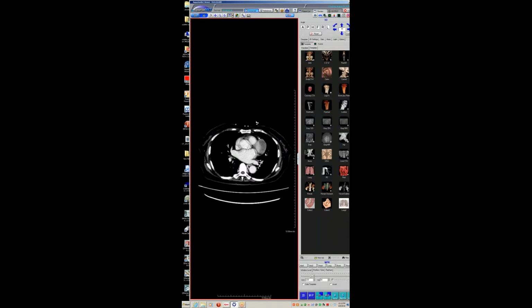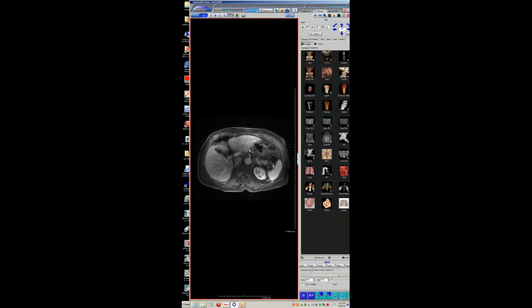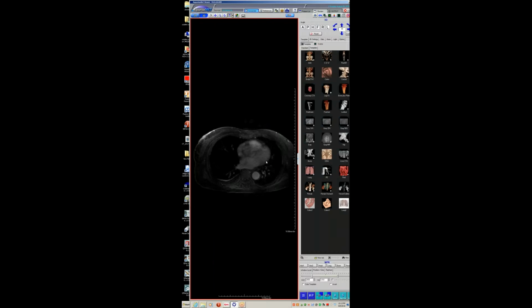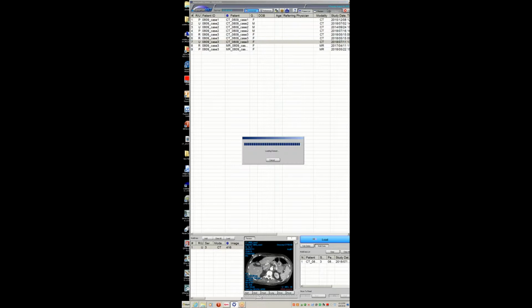And you can see here on the portal venous phase from that original study that showed that hypertrophied myocardium on the same day, that there's this large infiltrating hypodense mass. And just to confirm that this is new, here was a belly MRI from about 8 months before that showed that the heart was normal. So you have a large infiltrative mass in the myocardium in someone with, let me go back, someone with pulmonary nodules.